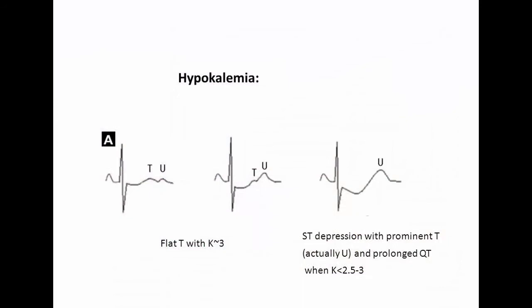You can also triage the different ECG features of hypokalemia. Sometimes the T wave and the U wave are separated. And as the hypokalemia gets worse, you can see that there's ST segment depression, and here there's big U waves where your T waves and U waves fuse together. Right. So if you're seeing this, particularly in lead V2 and V3, then you can triage this particular hypokalemic patient into a more severe category. All right.